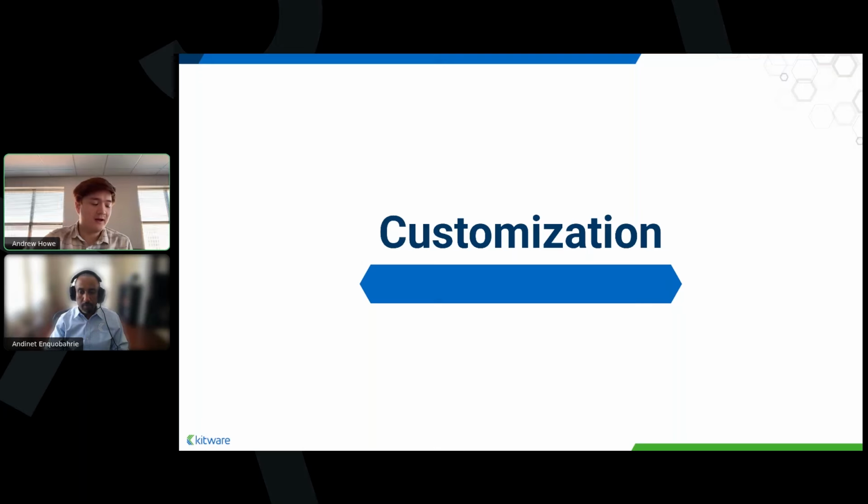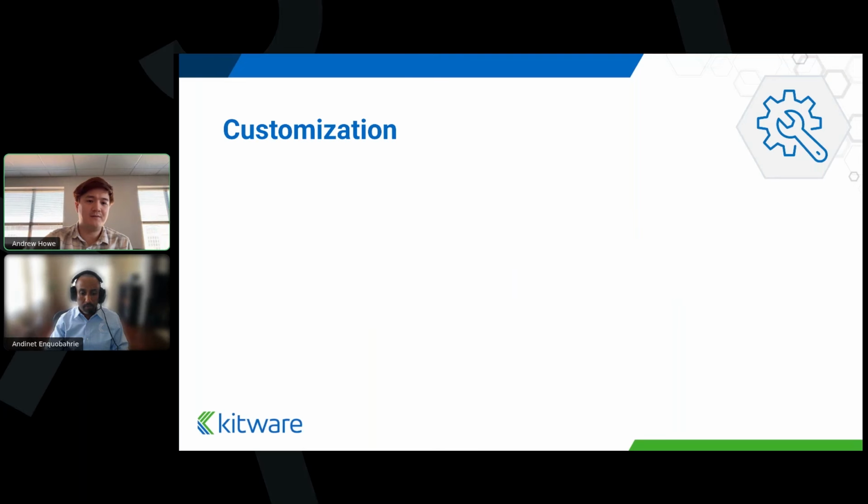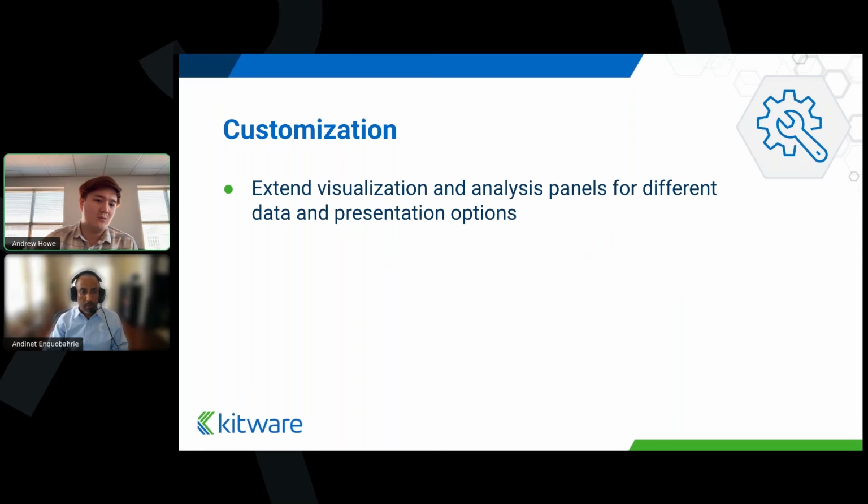Yep. And I also briefly want to touch upon customization, which we've gone over a bit, but just to get these things clear. One of the biggest strengths of VolView is the fact that it's so customizable. Everything you've seen so far, the viewer, the AI integration, the workflows, are built so organizations can tailor it to their needs. We really quickly set up this integration with NVIDIA's Clara models, just like we did with Google's MedGemma.